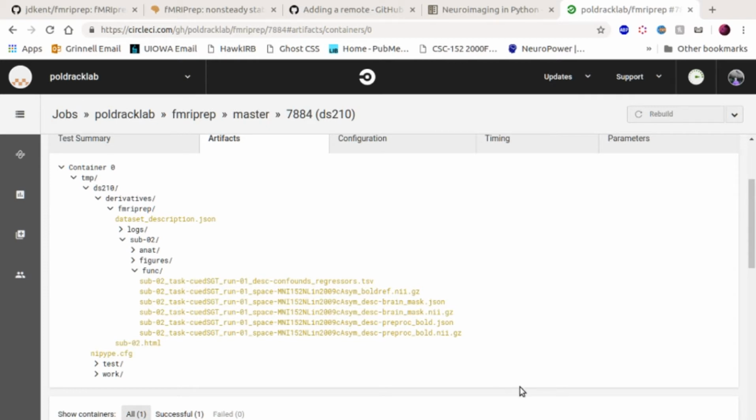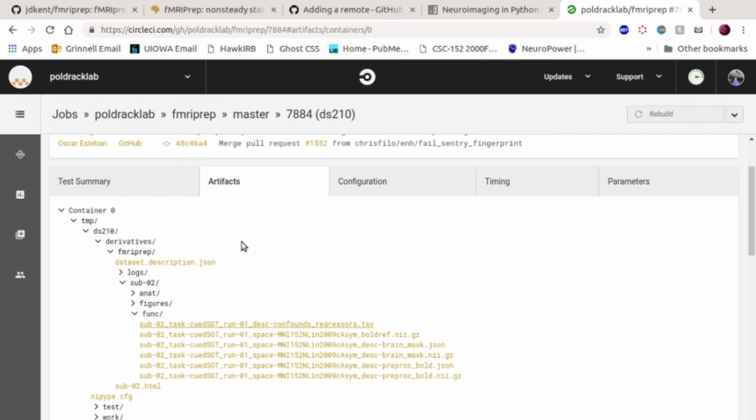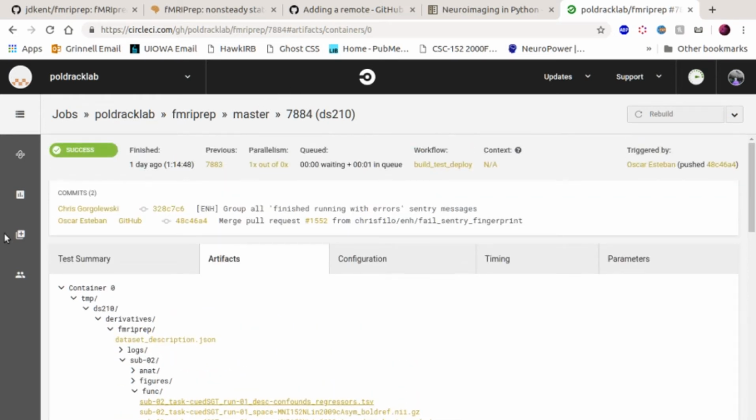Now we won't have an explicit test on whether or not it works if I add the option to test it here. But we'll know that that code is actually being run, at least. With the other datasets, it will just return 0. Okay. Alright, I'm going to use dataset 210. I'm glad that kind of worked out.